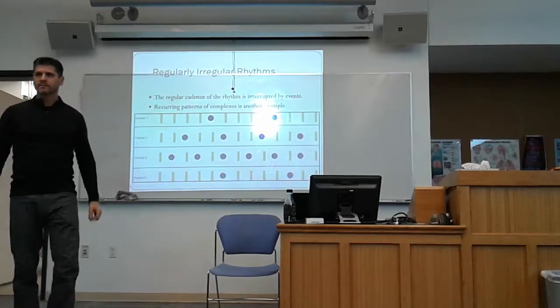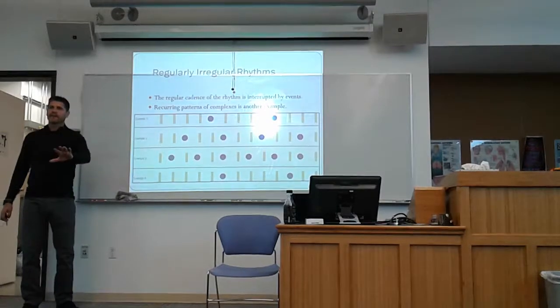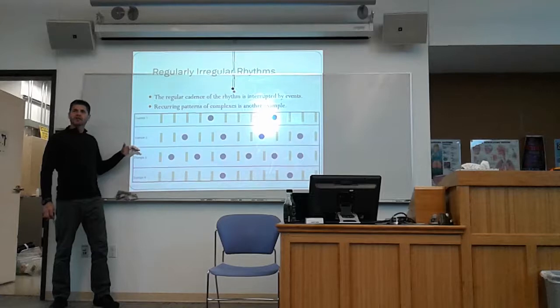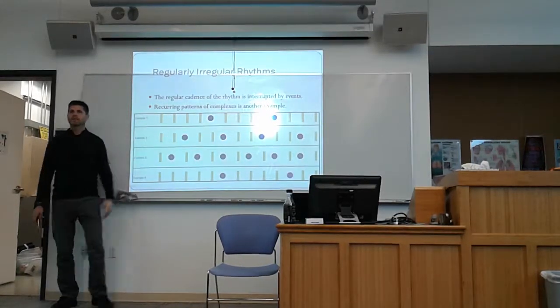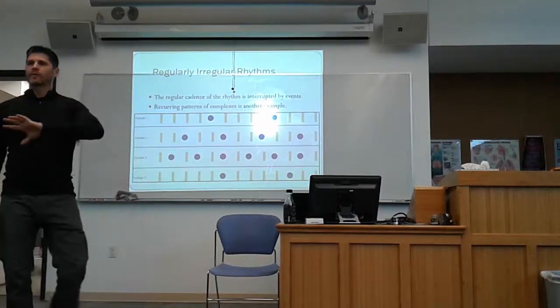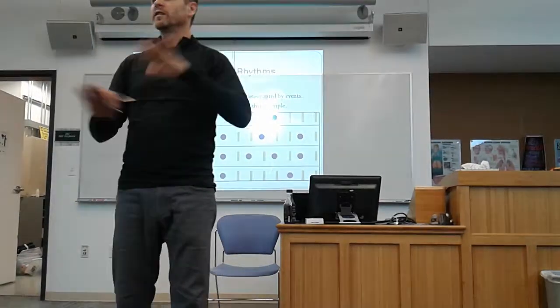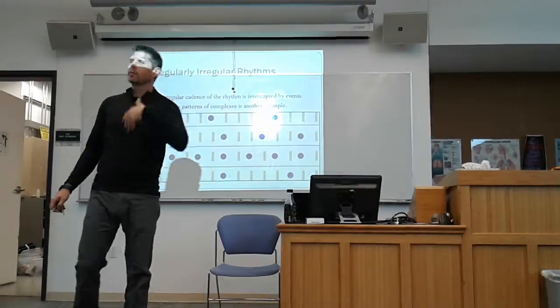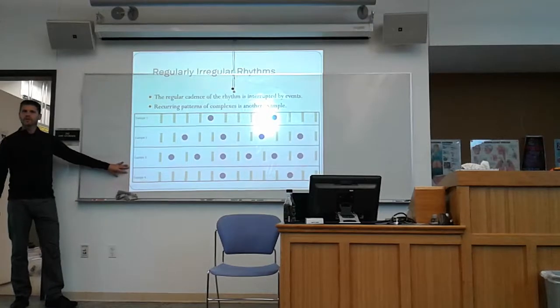So you're evaluating the crap in this instance only. I'm not identifying the crap, but in this particular case, I'm allowing the crap to influence whether or not I'm seeing a pattern emerge in what I'm doing. And I will tell you that some of the crap we don't do that with at all, and some of it we do. Like the first strip that I told you to eliminate the crap with, we wouldn't say anything about that causing it to be irregular. But other ones we would. You'll get comfortable with that as we start talking about it. Okay. You see what I mean by the pattern that emerges though?